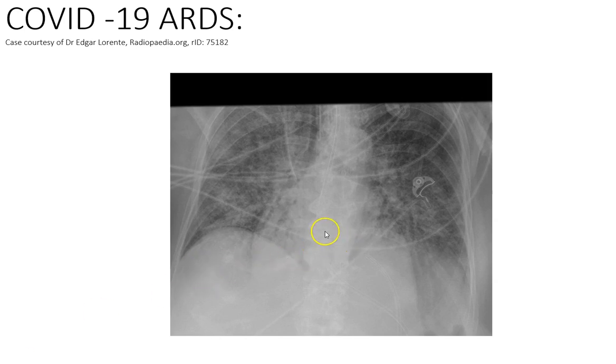This next film is a patient who has COVID-19 who's gone on to develop ARDS. This is typical that in ICU it's really hard to get really good films, like getting the board under the patient in the right angle and so on can be really difficult. And so we've got somebody who's not in an optimal position. We can't actually see their clavicles at all. But what we can see is this picture of ARDS, which is where we've got bilateral infiltrate throughout the whole lungs, increased lung markings everywhere. This is the trachea down to the bifurcation to the two main bronchi.